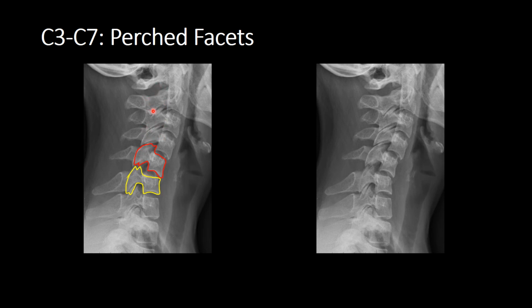Check your pedicles. Go down the lamina. Go down around the spinous processes. So bones are good. Cartilage, let's look at the intervertebral disc spaces, all looking very good.